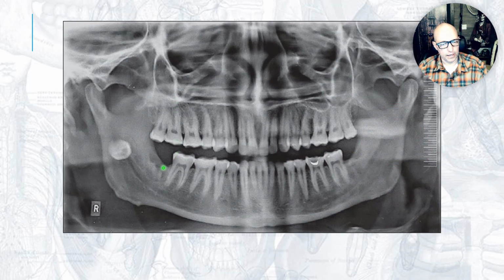All right, this was a case where someone was doing a surgery, extracted a third molar. Hey, they got it out, but then they lost it. Weren't sure if they swallowed it. It kind of disappeared. They took a panoramic radiograph. And here's the tooth. Way back here. Is this toward the buccal or lingual? What do we see on the opposite side? Do we see a ghost image of it? Yeah, right there. We said ghost images should be blurred. A lot of times they're stretched out like this. So this is a ghost image of that extracted third molar.